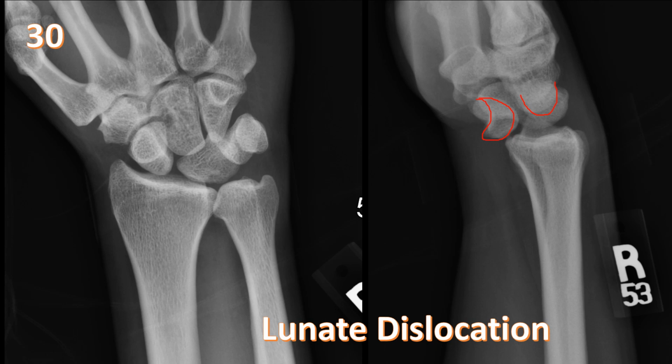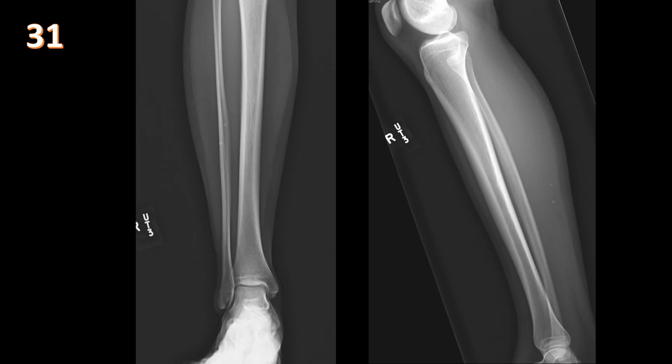The important thing is differentiating lunate dislocation from perilunate dislocation and fracture. In perilunate fracture dislocation, the lunate actually articulates with the radius, but then the capitate will be dislocated from the lunate. But when you see full dislocation of the lunate from the capitate and the radius, remember it's lunate dislocation and not perilunate.